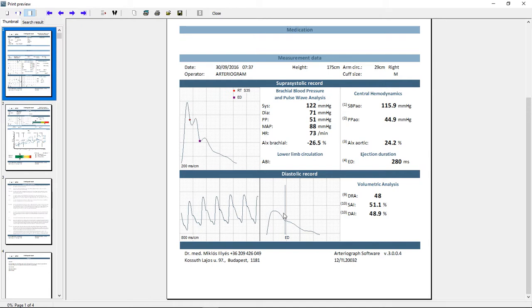This cannot be seen in the diastolic cuff pressure recording because of the flow and the Bernoulli principle, which plays a role in this process. Thus, obtaining the first and second systolic waves separated is not possible during diastolic recording.